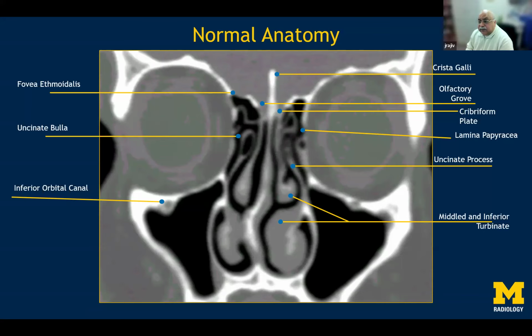For the sake of repetition, I just wanted to reiterate that all the sinuses which you saw do not have ostia which are dependent, in the sense that they drain the fluid by way of gravity. So the maxillary sinus infundibulum is situated high in the medial wall of the sinus. The frontal sinus drains into the nasal cavity via an opening which is more posterior directed and inferior.